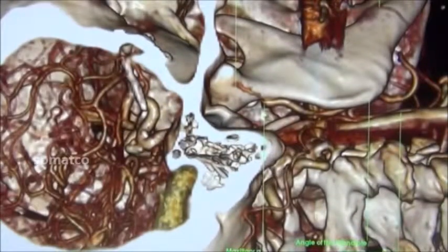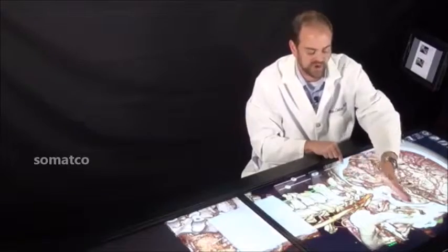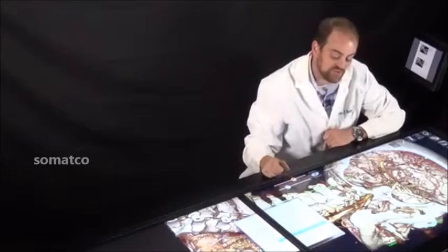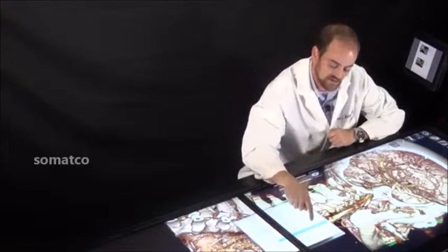Thus, we can cut back and forth to show that the maxillary artery is a branch off of the external carotid and will run anteriorly towards the face. Again, most of these vessels are listed as low visibility simply because they're a little more difficult to see.